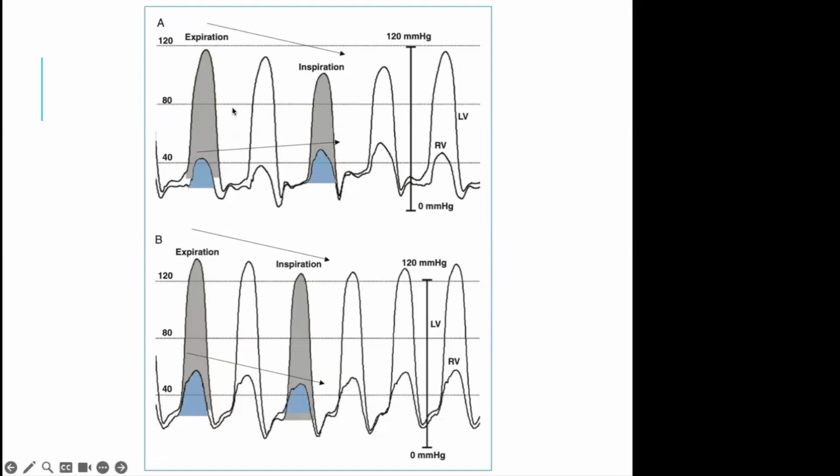Now, this is, again, a right and left heart cath. We saw one of these before, and one of them is new. So looking at this, I don't know if someone wants to jump in and tell me which one's constriction and which one is not.